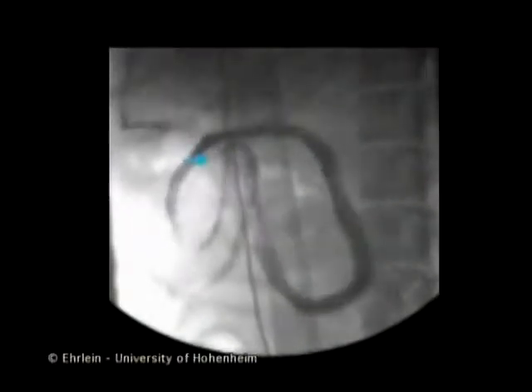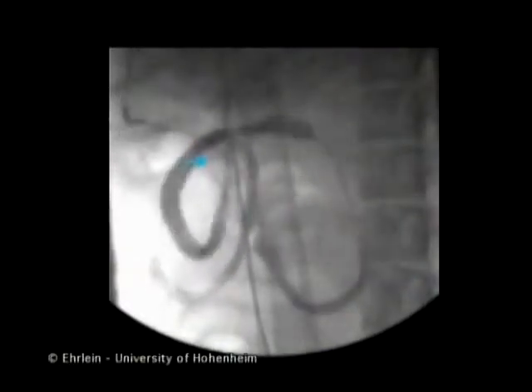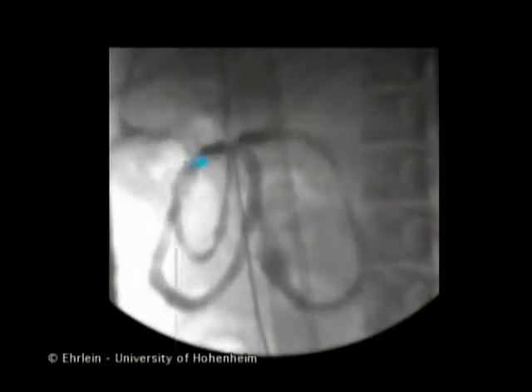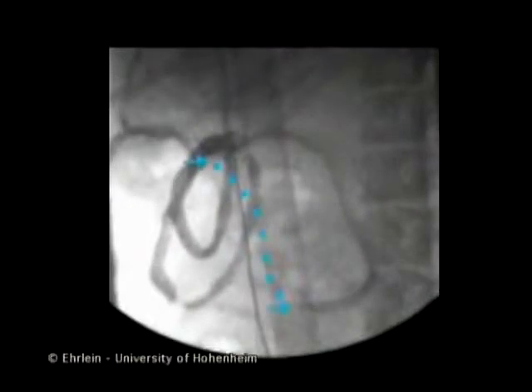The chyme that has accumulated in front of the phase 3 is propelled further distally by the peristaltic waves. The dotted line shows the distance of migration from the distal duodenum to the proximal jejunum during the period of observation.